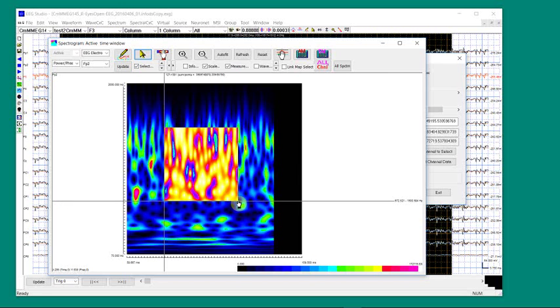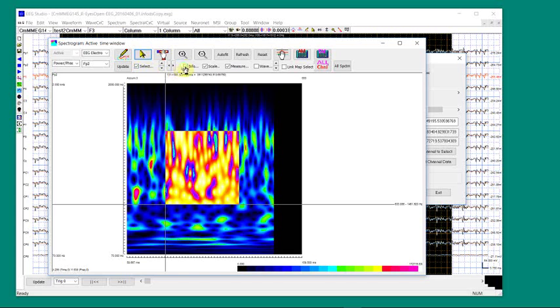You can select the range and measure the power. Of course, you can move the spectral. Use this one. Or you can click the information here, so that will show you which channel, the maximum, minimum, and this means the range.